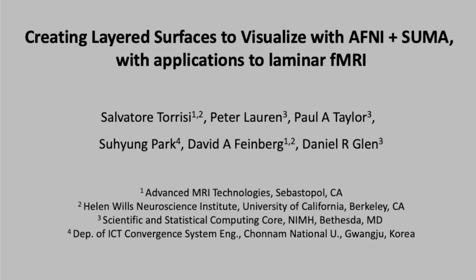This video explores some new features for investigating datasets in AFNI and SUMA, which could be useful for layer fMRI. These include new SUMA clipping plane functionality, as well as the SurfLayers and QuickSpecSL scripts we demonstrate across 3 datasets.